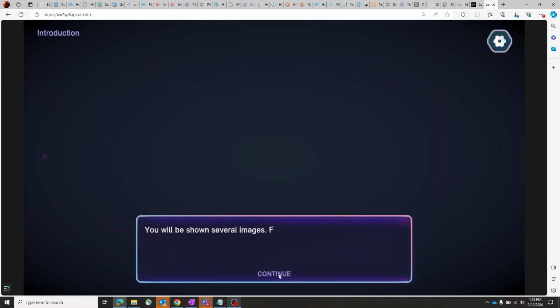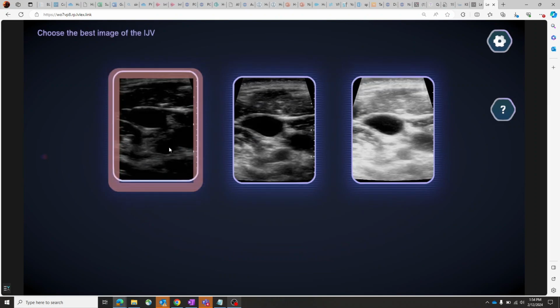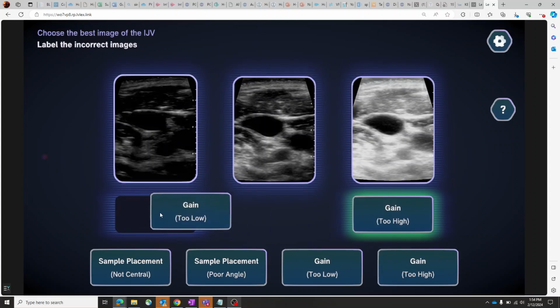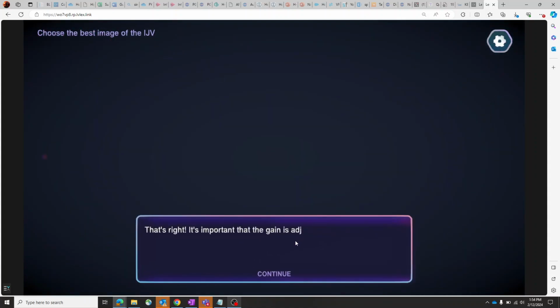And what we did to generate the 3D anatomy, which we also call the domain space, is we took an image set of, you can see here we're scanning through this image set. This was freely available online, developed by the NIH. And what they did is they spliced the human cadaver at several sub-millimeter increments, and then took high resolution color photography and paired that with CT and MRI scans. We were then able to import this image set into our game engine and turn it into a volume.